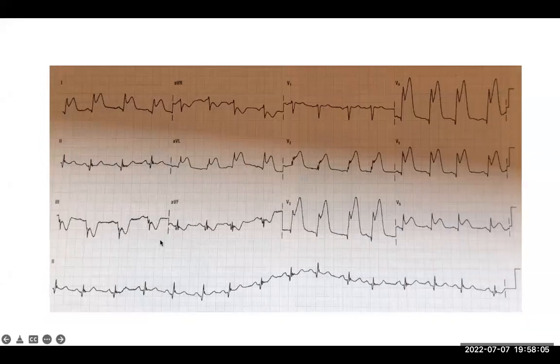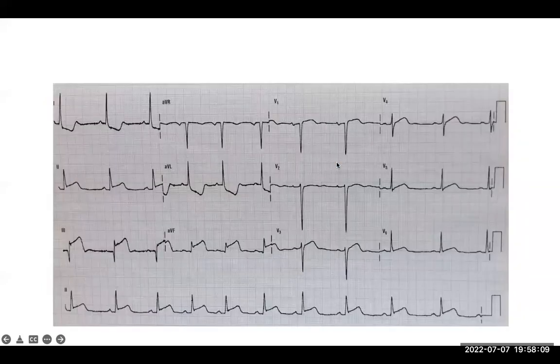Yes, this is another ECG. As you can see, there is widespread ST segment elevation, but the most important thing is the ST segment elevation in the anterior leads. In this one, ST segment elevation is mostly found in the inferior leads. And because this is a lateral lead, lead AVL and lead 1, that's why there is ST segment depression. And as I told you, ST segment elevation in the inferior leads, please just throw your eyes at V1, V2 so that you don't miss posterior MI.